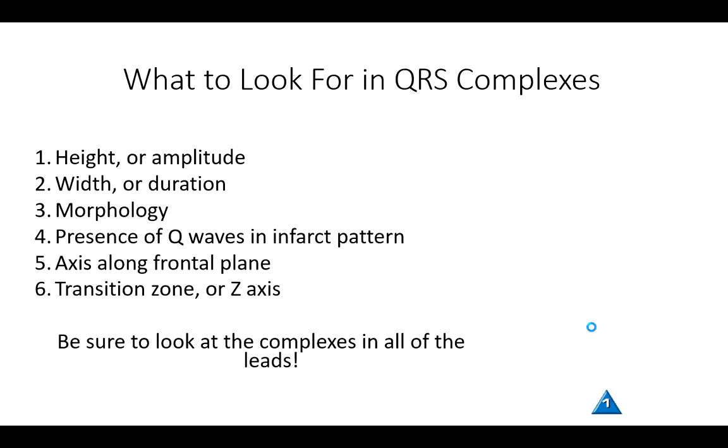We're going to look at a lot of different things in the QRS complex. And folks, don't get bogged down by the large number of things that we're discussing, because this EKG material would be a multiple-semester class, multiple lectures. But these are some of the bullets, some of the highlights. Each of these is going to tell me something different.